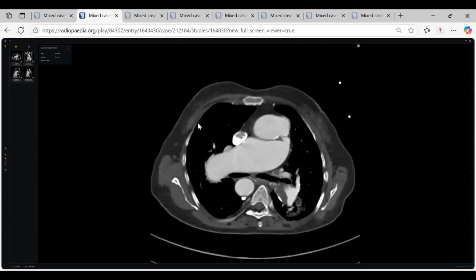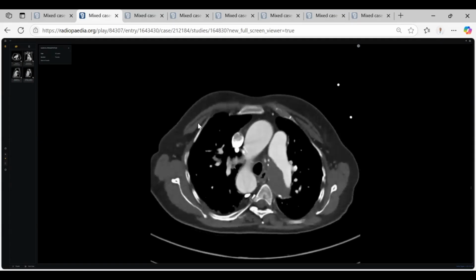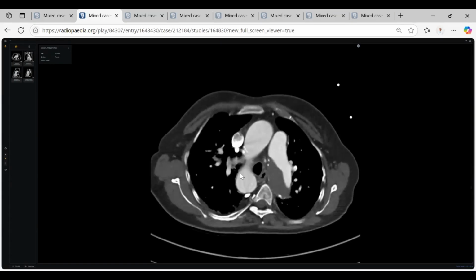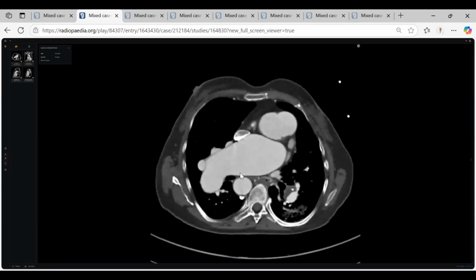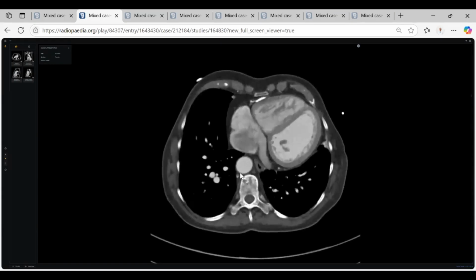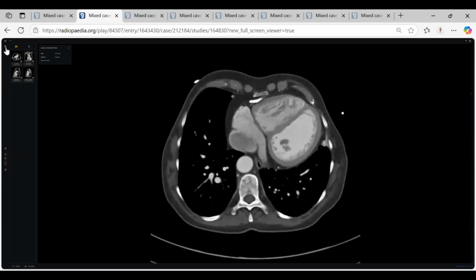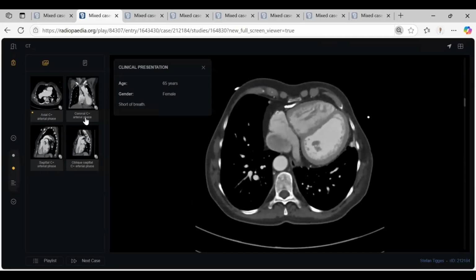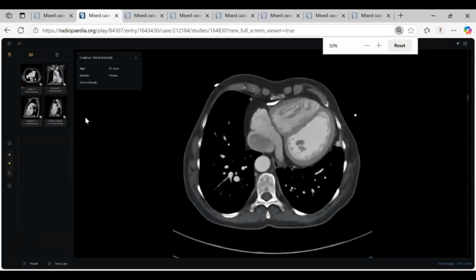And there is, Doctor, see, this looks like chronic. There are calcifications. Yes. What do you think, does this patient need to be managed surgically or medically? This patient should be managed medically. Yes, because of old age. Thank you so much, doctor. You did very, very well, really.